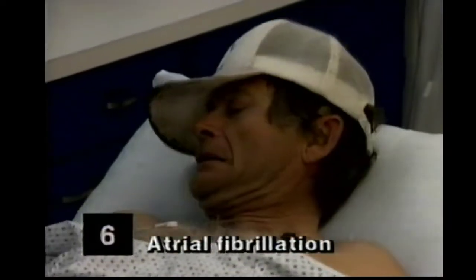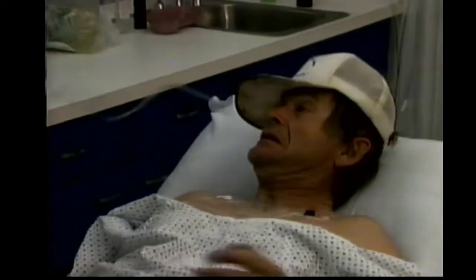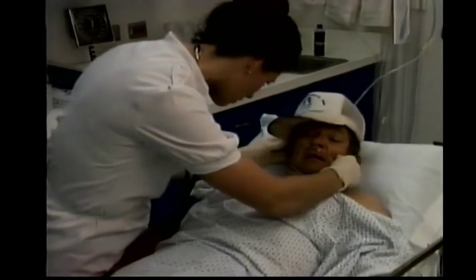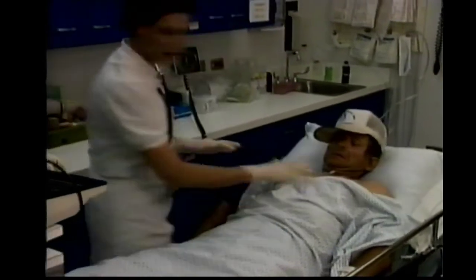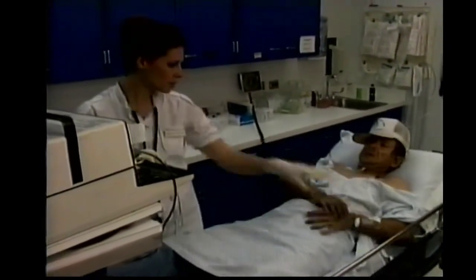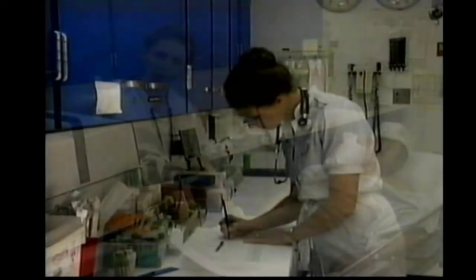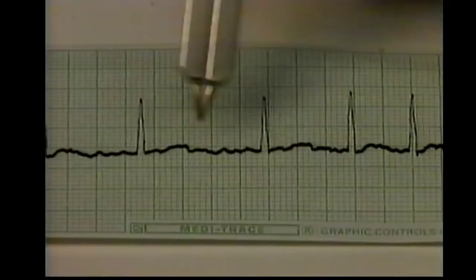This 50-year-old man has a long history of alcoholism. He has come to the emergency department complaining of heart palpitations and dizziness. His apical heart rate is very rapid and irregular. His radial pulse rate is also rapid and irregular. His blood pressure is 96/64, and peripheral perfusion is decreased. A baseline rhythm strip reveals the following information.